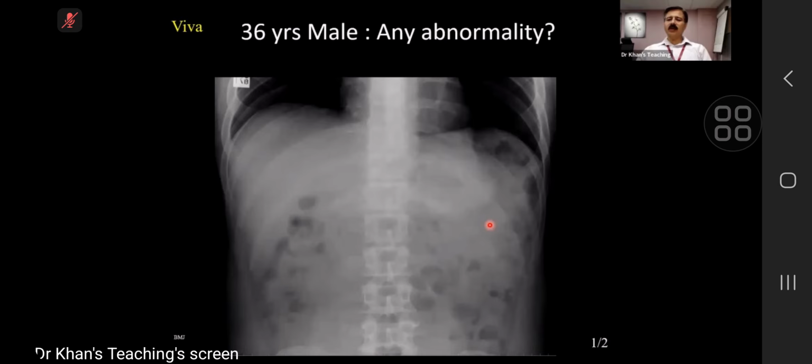Okay, so I'll give you a very interesting hint. I think this is from BMJ, and this is a case report. This X-ray was done at Heathrow Airport, and this patient, according to that case report, was then spending time in Chelmsford jail. Now over to you.